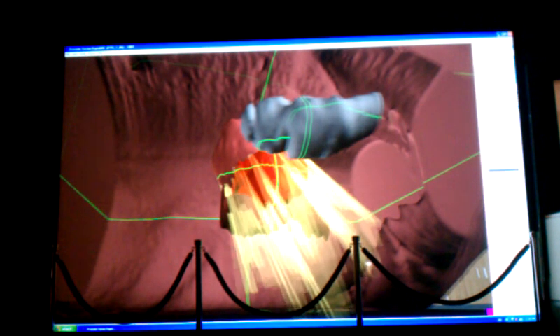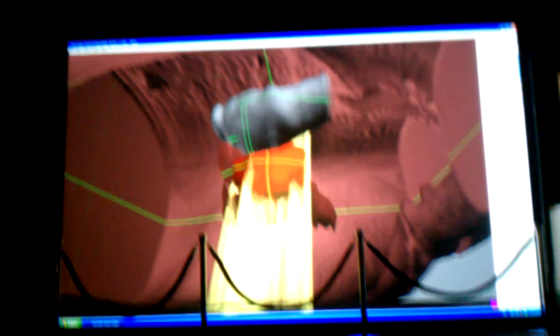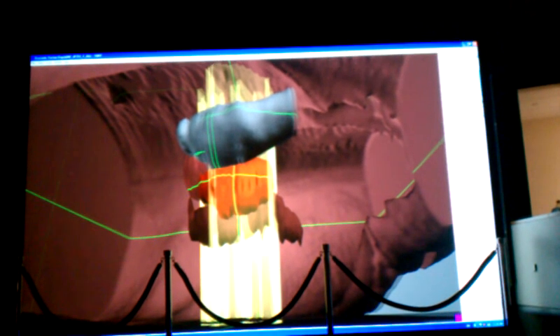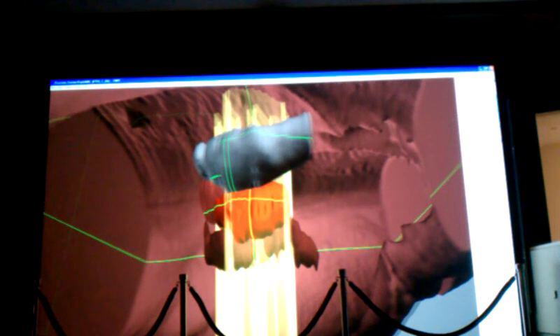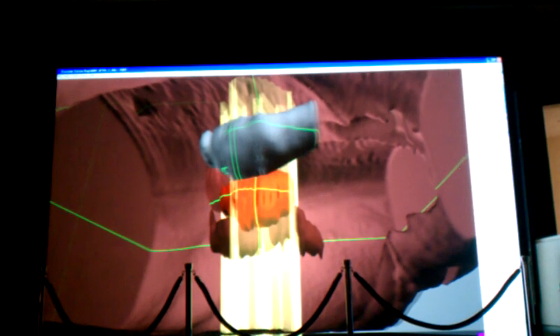What we can do in a safe environment is, actually the students will say, well, come on, really, what does it mean if you're 2 millimeters off? Well, let's go 2 millimeters off and let's take a look at exactly what's happening to the rectum and the bladder and what part of the tumor is not being treated because we're 2 millimeters off. Okay, which direction do you want? So that the students can see that firsthand. Okay, let's go. Yeah, looks like they're too low. So create some set of error in here.